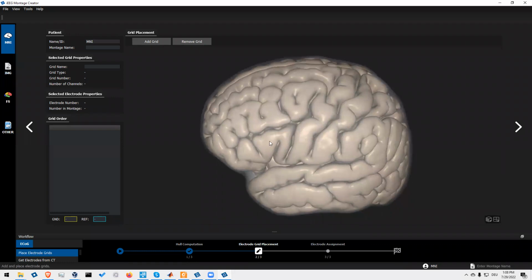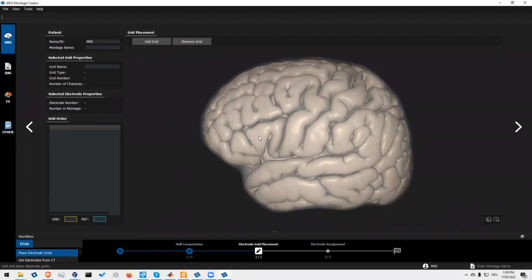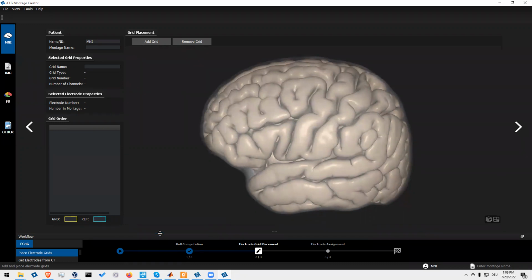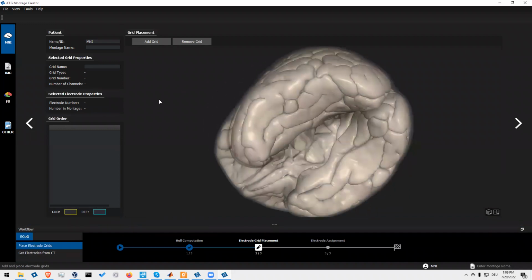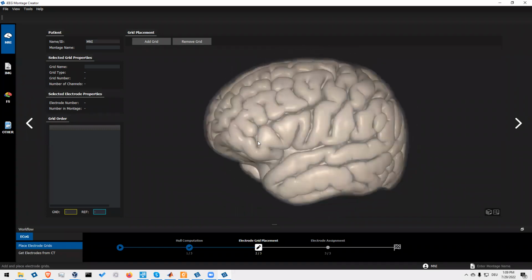This is possible for everyone at any time, so you don't need any additional data. And then there are 3 more options which I will explain later on.